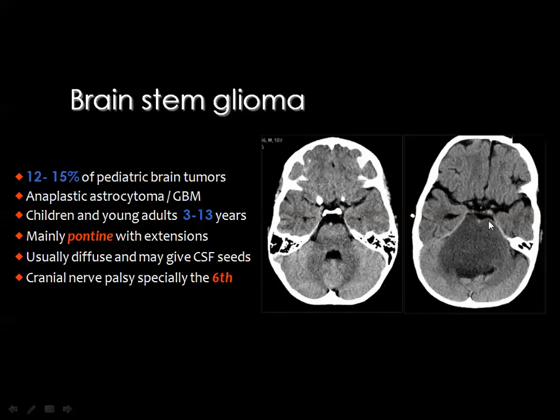You know that the tumor, if it leads to a swelling of the brainstem, should displace the basilar artery anteriorly.